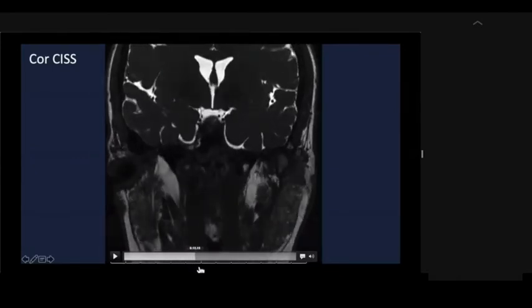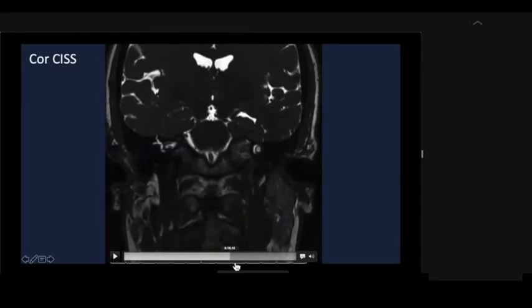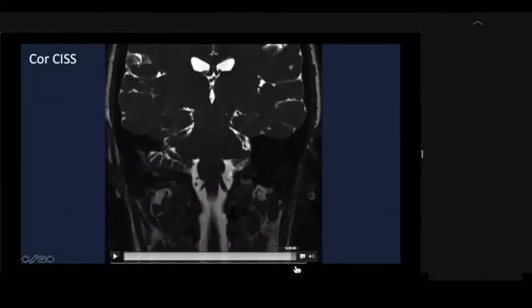As we get to our cystic lesion of the right petrous apex, you'll see that it's separate from the mesial temporal lobe. As such, this is unlikely to be an encephalocele. In fact, the two structures are actually separated by what appears to be a small membrane. More posteriorly, the cisternal segments of the trigeminal nerves are normal, and again we see the remainder of the lower cranial nerves.